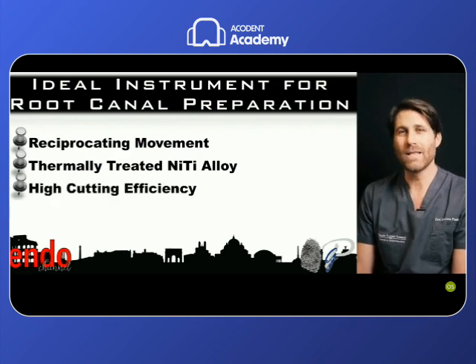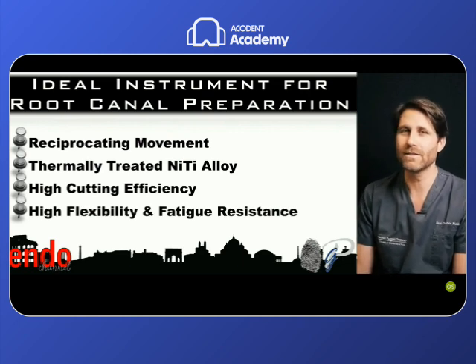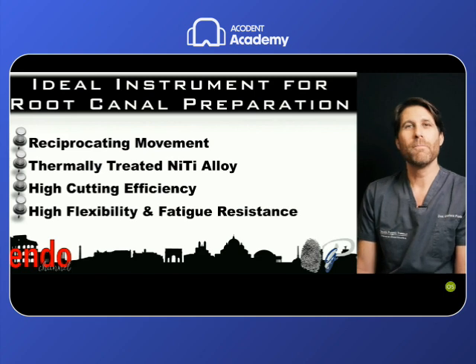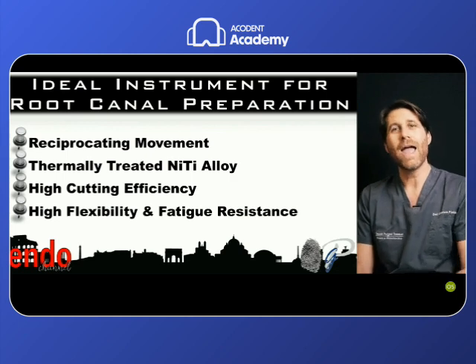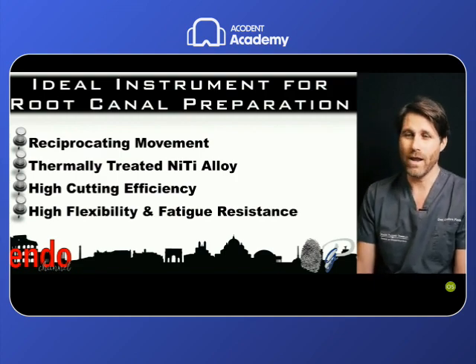Is an instrument with a high cutting efficiency and a high flexibility and fatigue resistance. Both properties permit the instruments to advance easily inside the root canal, even in the more constricted root canals, and to advance and to penetrate even the most difficult curvatures or double curvatures in a safe way.